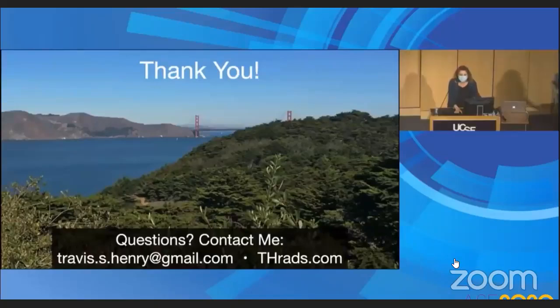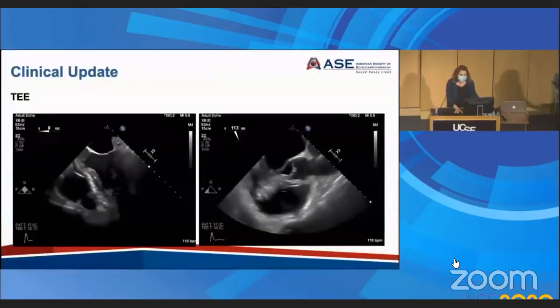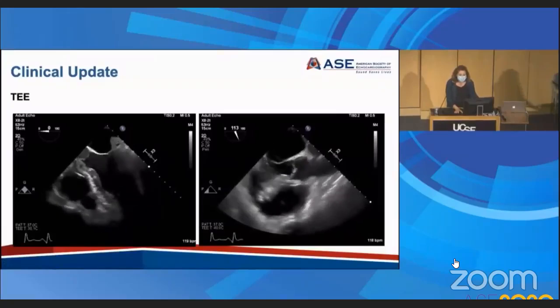Thank you so much, Dr. Henry. We have a quick clinical update. Here's the transesophageal echo for our patient. It was performed the day after he presented. Again, we see the prominent muscular ventricular septal defect.